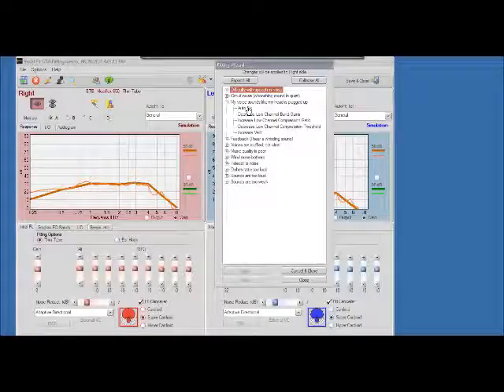Now, AutoFix at the top. When you highlight AutoFix, if you work with this, it will do each of these things that you see below it. Now, down at the very bottom, you see Increase Vent. Obviously, the software cannot increase the vent size for you, but it is telling you an option that you can try. Now, as far as the other options, decrease low channel band gains, increase low channel compression ratios, and decrease low channel compression thresholds, the software can do all of that.